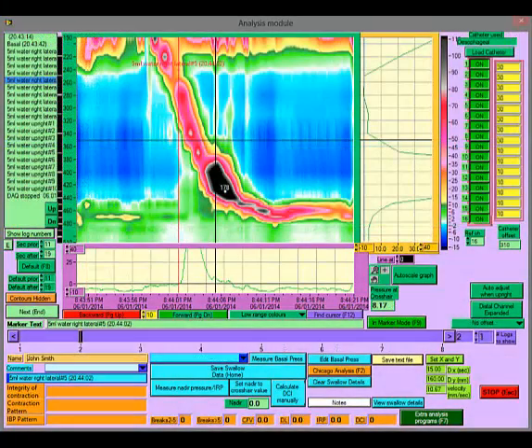In marker mode, you can navigate to any point in the study where you entered a marker. But if you wish to scroll through the study or examine other time points, you'll need to change the display to log mode. This mode is named because the data is saved in 30-second periods or data logs, and in this mode the data is displayed by time period, independent of the presence of markers.